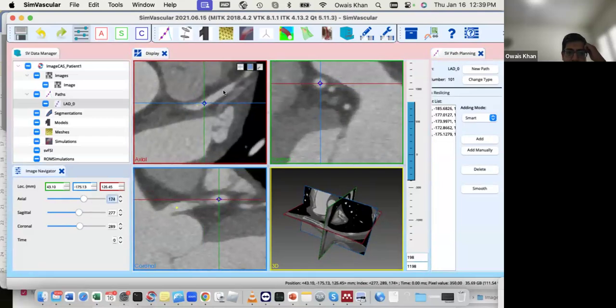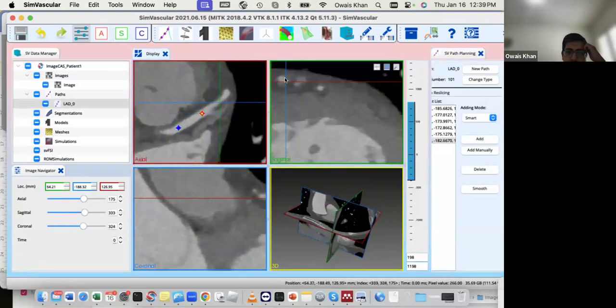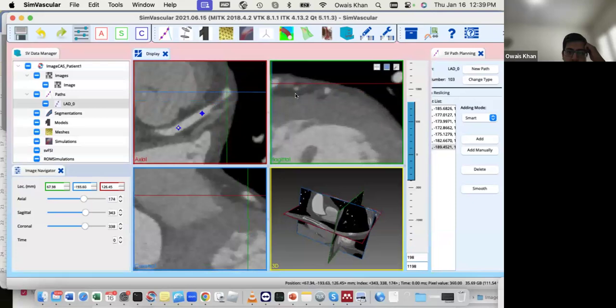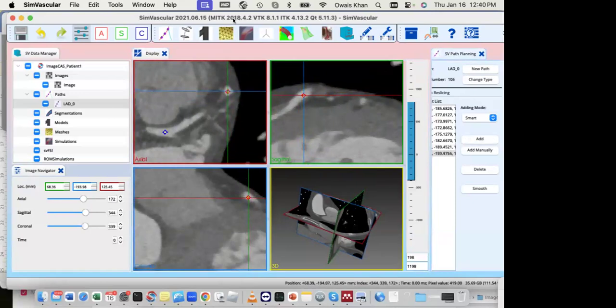I'm going to keep going, click here, make it centered here, make it centered here, add. Keep going. It's not in the center here. I'm gonna make it centered here. Zoom out, zoom in, centered. Keep going. Keep following. Click here. Maybe center. Is everybody able to follow along? Is there any trouble so far? Yes, no? Good so far. Okay.